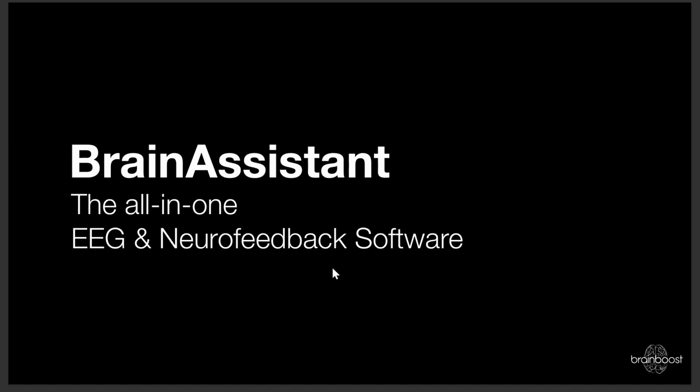In this webinar, I will show you how we perform our first assessment, but of course you can also use this to perform all 5 or 10 sessions in assessment in between. I will show you how you can easily create an auto report using our software. For this, you can use several amounts of channels: 3 channels, 8 channels, or 19 plus channels. Have fun using it. Let's start.